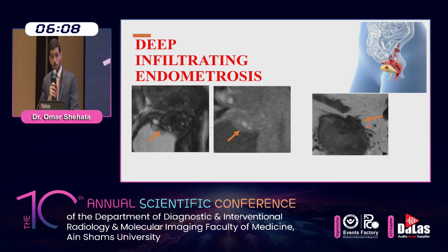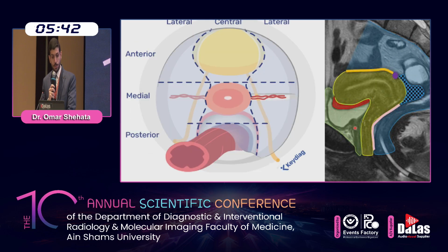The second one is chronic stromal fibrotic morphology, which appears on MRI as T1 and T2 hypointense linear or stellate shape, like here, that may cause tethering and obliteration of spaces, resulting in fibrotic scarring across a peritoneal or retroperitoneal space, bringing adjacent organs into fixed contact with one another.